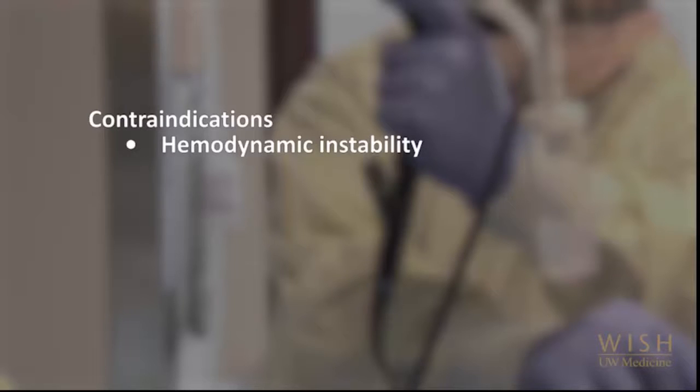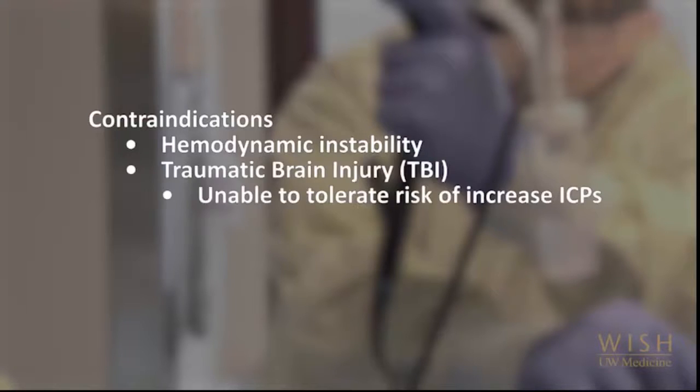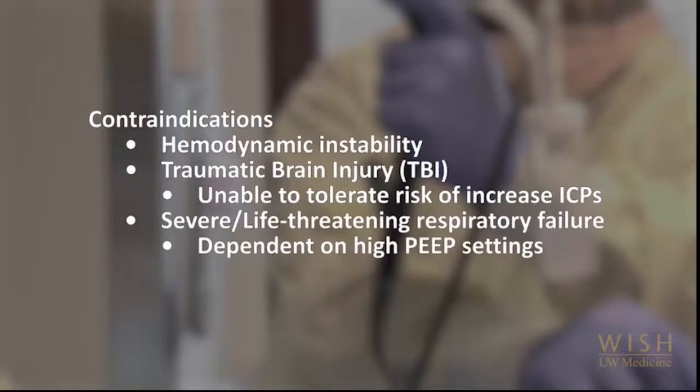Patients with hemodynamic instability or those who cannot tolerate increased intracranial pressures should not have bronchoscopy performed. Likewise, patients who have life-threatening respiratory failure and cannot tolerate any degree of worsening hypoxia or hypercarbia also should not undergo BAL.